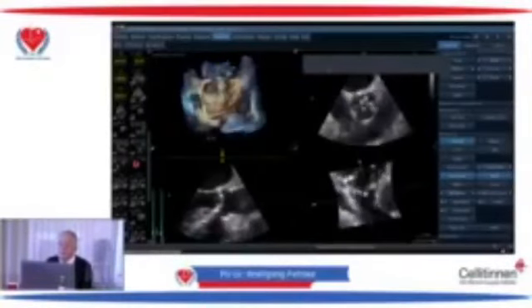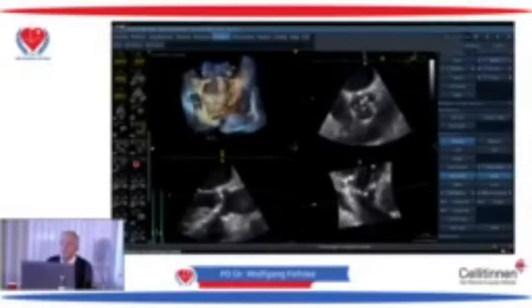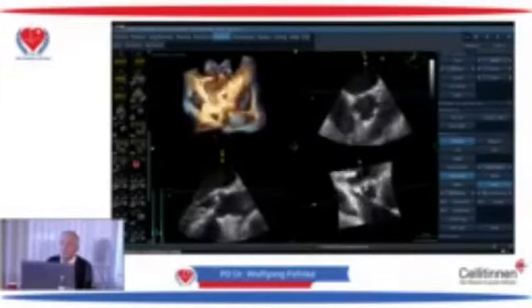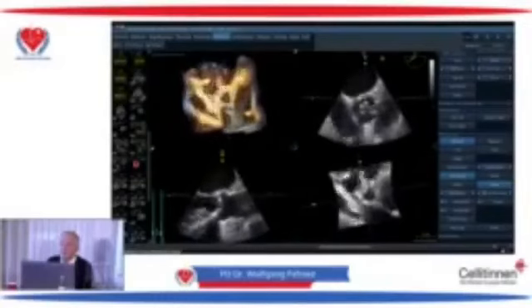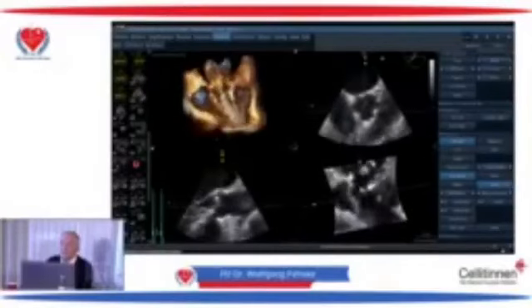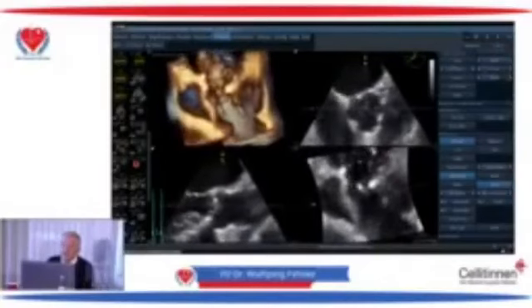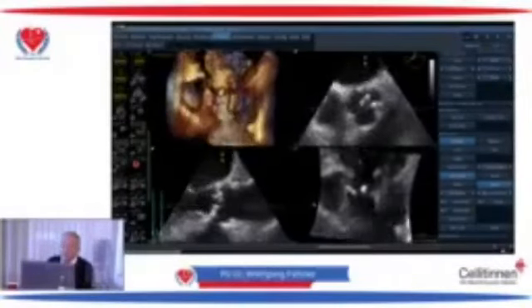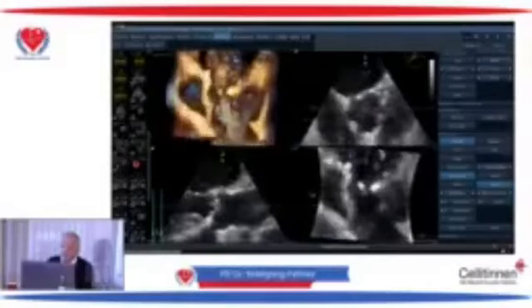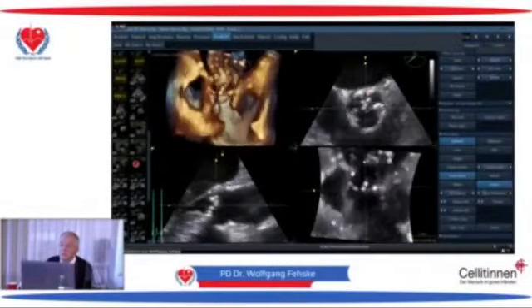And again, sorry. This is a little bit tedious work here. Zooming out. Okay. And then I try to put it completely in a rectangular scheme, and then valve, you see, and this is a good question that you have put to me.